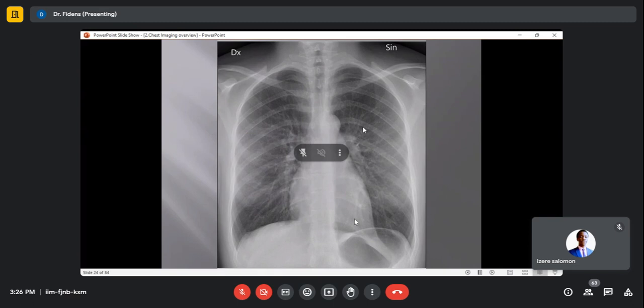Yes. This rib is crossing the clavicle, you are not counting it. I count it, look here. Don't you see that the first one anteriorly... remember, anteriorly the ribs are oblique. Remember, anterior ribs are the oblique ones. They are not these ones. These are posterior.